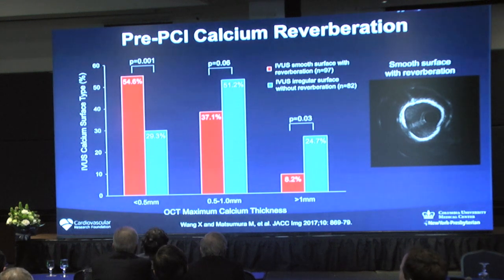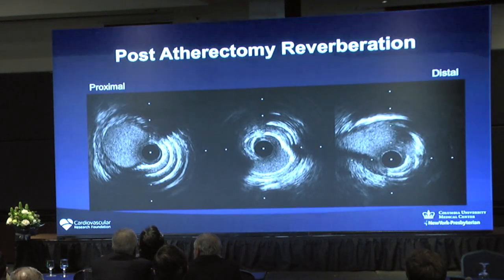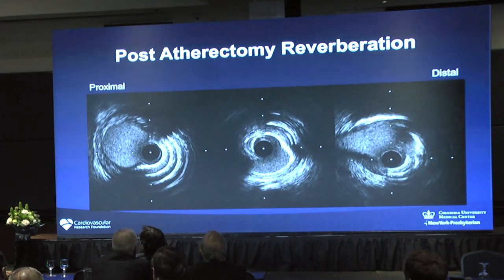But the correlation is not 100%. So when we use this information to predict the thickness of the calcium, you have to be cautious.